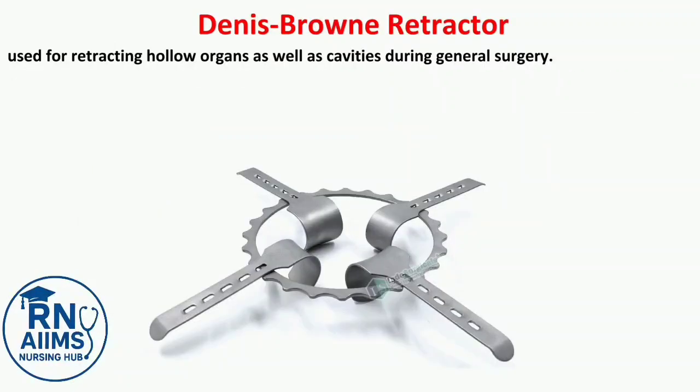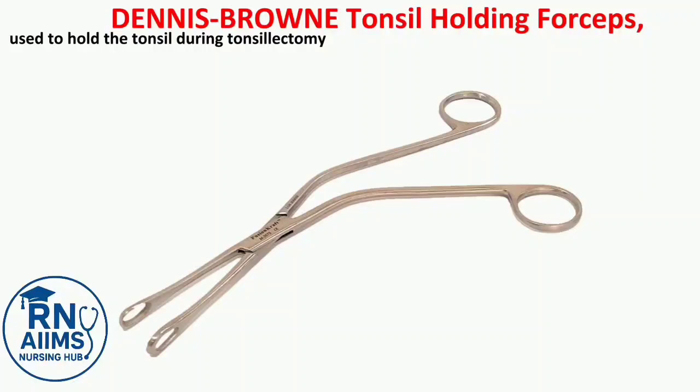Dennis Brown retractor used for retracting hollow organs as well as cavities during general surgery. Dennis Brown tonsil holding forceps used to hold the tonsil during tonsillectomy.